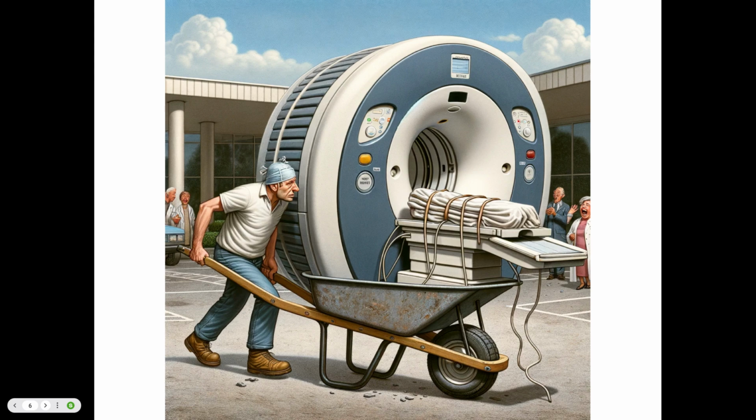It's portable. Take it to the bedside. Patient doesn't have to move oftentimes for you to get the views that you need. And if they do have to move, they can stay right in their bed. You can just unbutton their gown a little bit or lay the bed a little flatter. And you can monitor disease progression or response to therapy. You can do it every day.